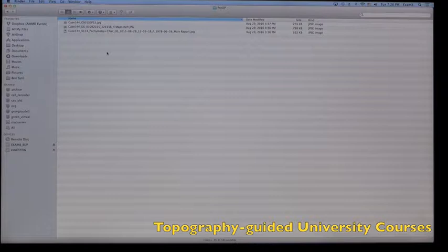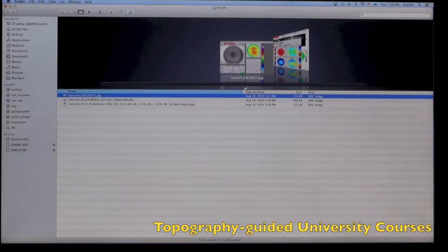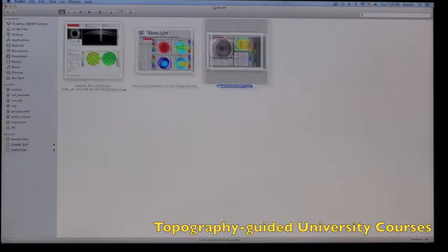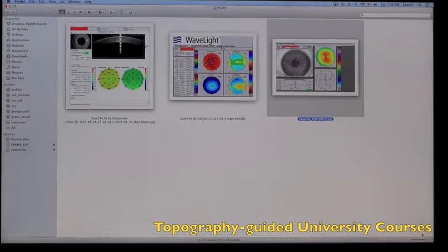You have the ability, let's look at this in picture mode. So let's click all the way on the left, there you go. So we'll see this in picture mode, and on the bottom right of your screen, you can enlarge those pictures. Great. So here in the pre-op information, we have almost in all cases a placido disc topography. You can see here on the right, pentacam topography in the middle, and an OCT anterior segment scan which shows cornea thickness and an epithelial map. So these are the pre-op data for us to evaluate.